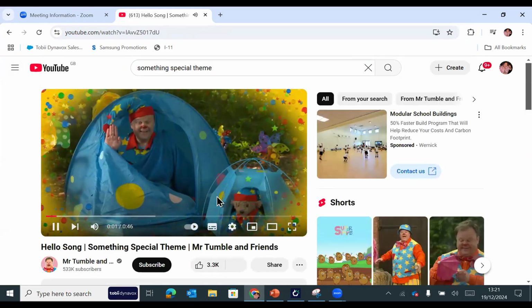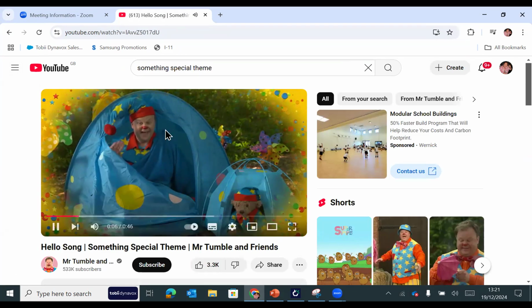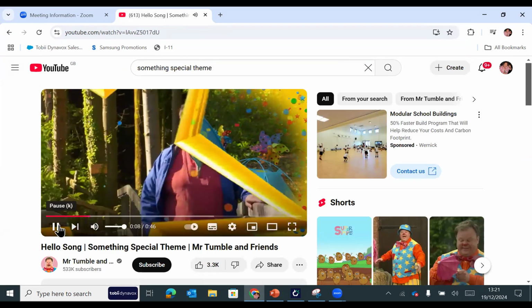Take your hand, just like so. Move it around and say, hello!